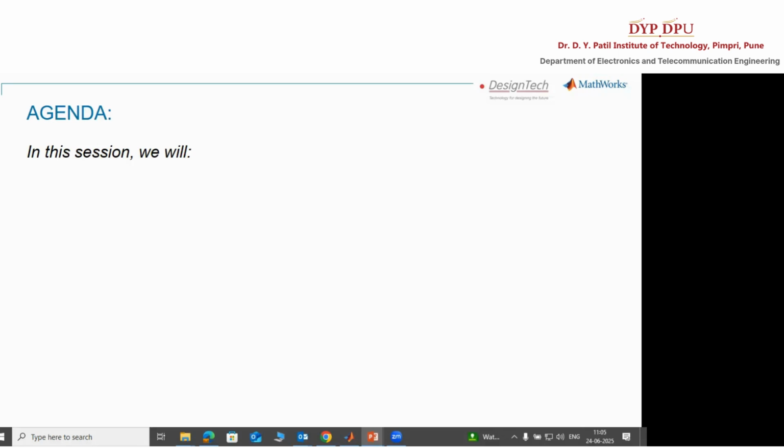As we have 2 hours of time and my PC has 12 GB, there are some system requirements to handle medical images. We will learn how to import data, visualize, pre-process, and segment the image data, and how to train and use AI models on the data. These are the things we are going to cover today.